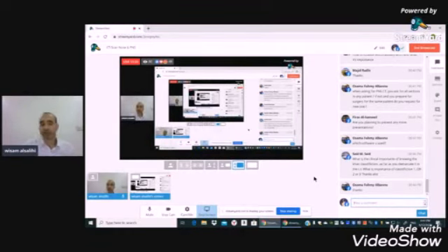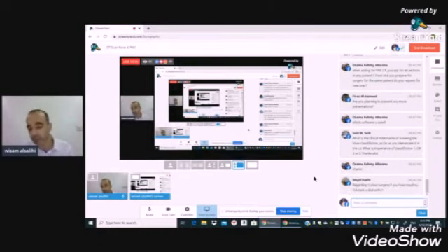The importance of the classification. You have to know if this is a type T1, T2, or T3 cell during uncapping the egg, as per Stammberger's principle of opening the frontal recess. You have to know, when you open this, whether you are in the frontal sinus proper, or still in the agger nasi, or still in the type 2 cell. You have to know how many cells are in front of you above the agger nasi cell. So it's very important to know how many cells are there, 1, 2, 3 cells.